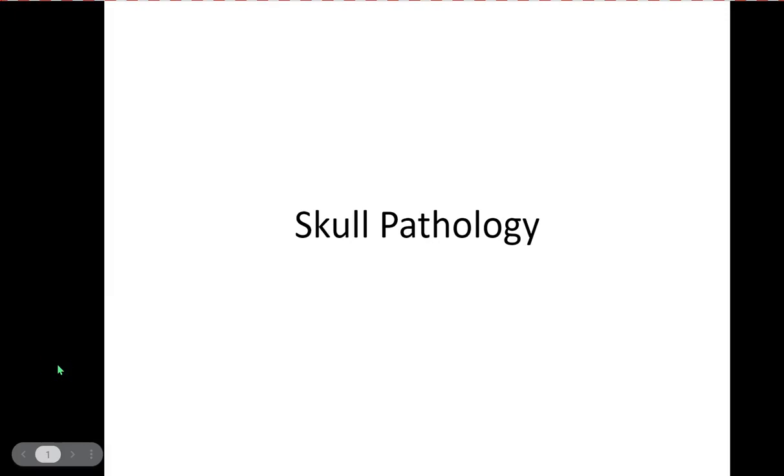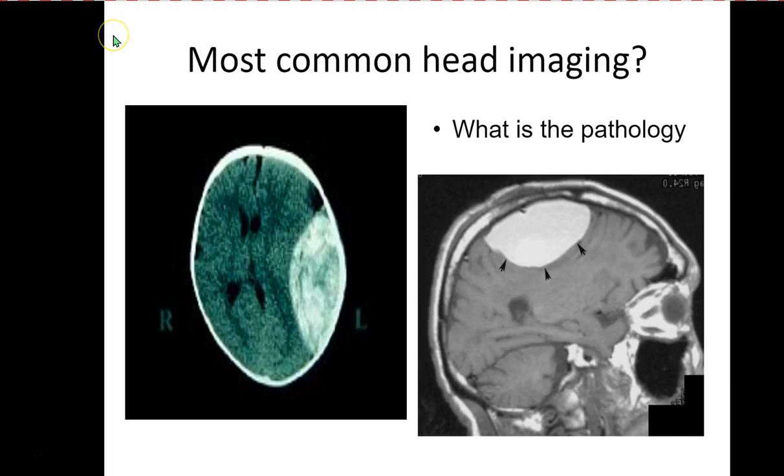Hello, and welcome to part 1 of skull pathology. While CT and MRI are certainly more commonly used for brain and skull imaging, in this presentation we'll take a look at some plain skull radiographs to help identify some of the more common skull pathologies you may see.